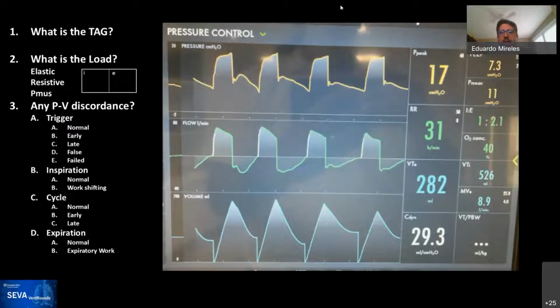Today, the topic, I thought that we should take a little bit of a look into the world of the volume waveform as much as we can. And so I'll ask, as usual, for any of our fellows if they want to volunteer to read this waveform. And have no fear. Any of the fellows wants to read it? All right, maybe I have to trigger a little bit the thought process here. So let's start with this one.